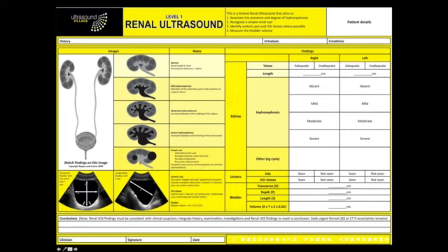An extrarenal pelvis is where the renal pelvis is out here, and it can actually collect urine in it, which need not necessarily be hydronephrosis. It's just an extrarenal pelvis. Then in terms of ureteric jets, use colour Doppler and wait. Ipsilateral jet presence excludes complete obstruction, which makes sense. But if the jet isn't there, it doesn't confirm obstruction, because quite often a patient's just dehydrated and you're just impatient.